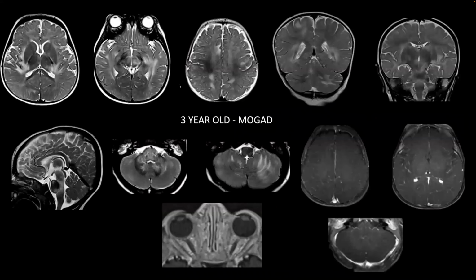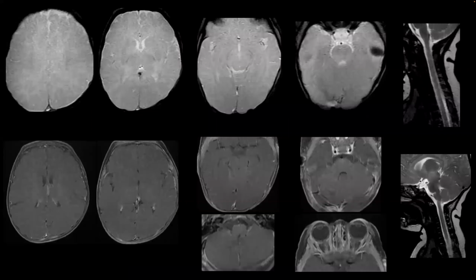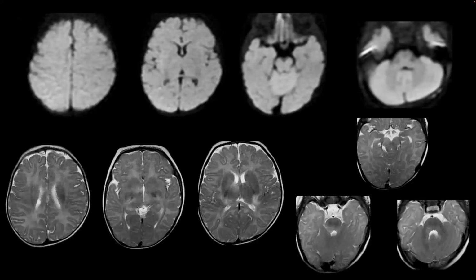We were not sure if an antibody-related disorder is a possibility. This was a child, though a slightly older age at 3 years old, where you can expect a more common age group. Again, it had similar abnormalities to those seen in the index child, these multifocal areas of involvement, predominantly central regions, white and gray matter structures. But this is a 3-year-old and our child was a 4-month-old. So we wanted to know if it is common to expect antibody-related disorders at that age group, or to think of infectious causes primarily for our index child. So that's the imaging and the clinical part, and I'll open the case for the panelists to comment upon.